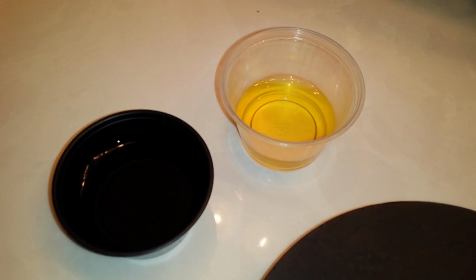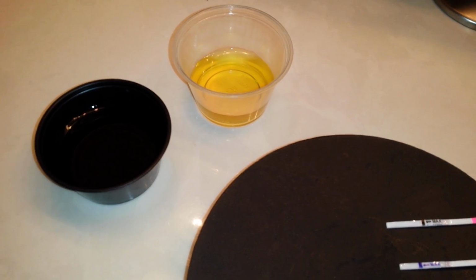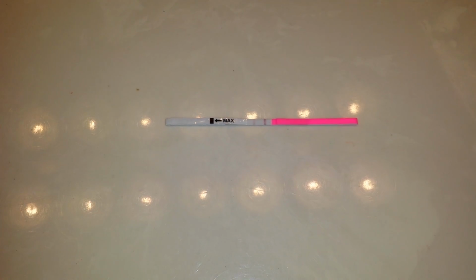More so than anything else, I just want to see if an OPK will result in a positive test line if it's detecting HCG or not. And that's what we're going to find out today. Now, I've already dipped the stick with the normal urine sample right here. And so far, being as how it's super, super diluted, if my camera would ever focus, that appears to be a negative result.